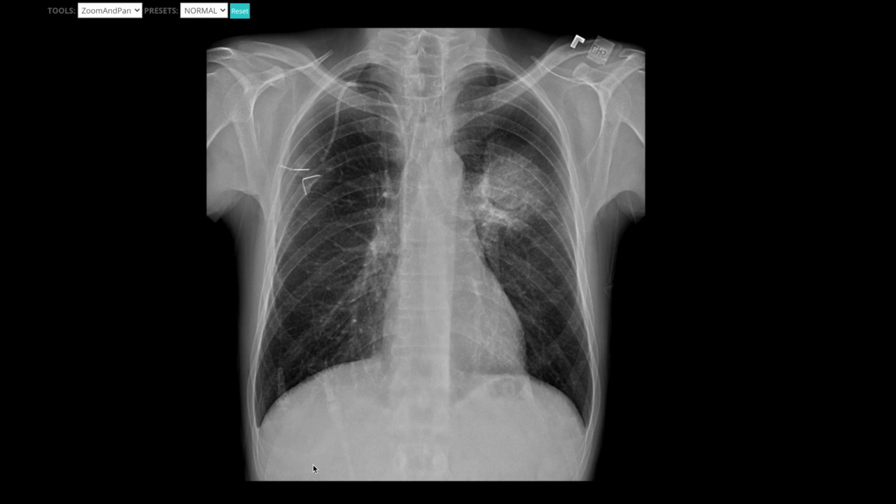You oftentimes will see renal stones, gallstones. Sometimes you can even pick up, I guess this is more so in a KUB, but hepatomegaly or splenomegaly are going to be pretty common. And then obviously pneumoperitoneum is one thing that you don't want to miss. And I'll show you in other videos differentiating between the stomach bubble and an actual pneumoperitoneum.